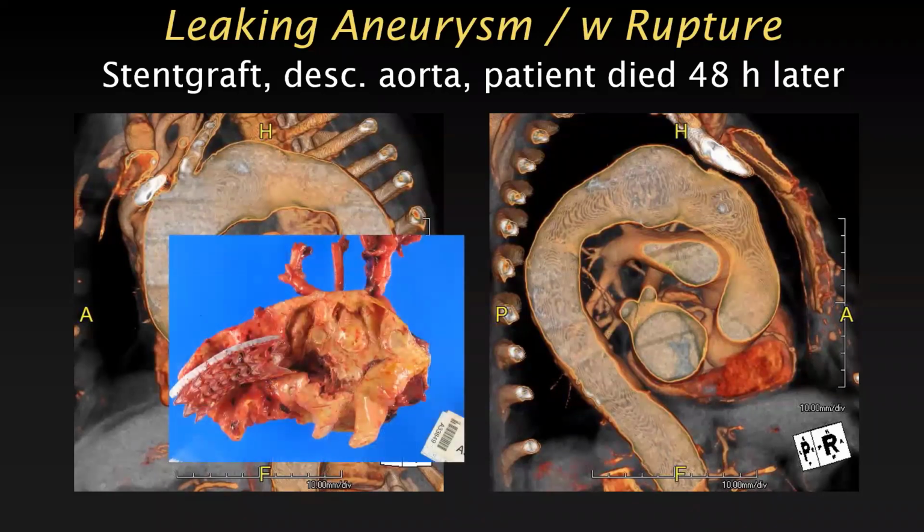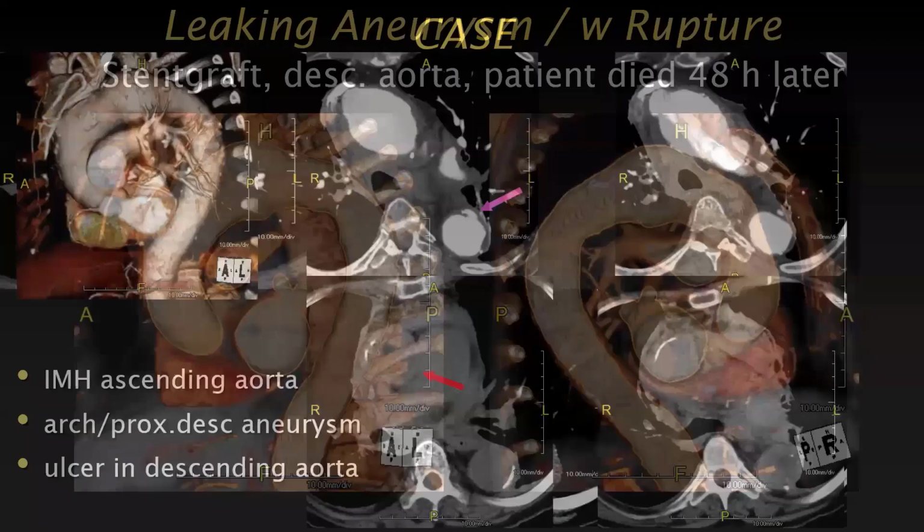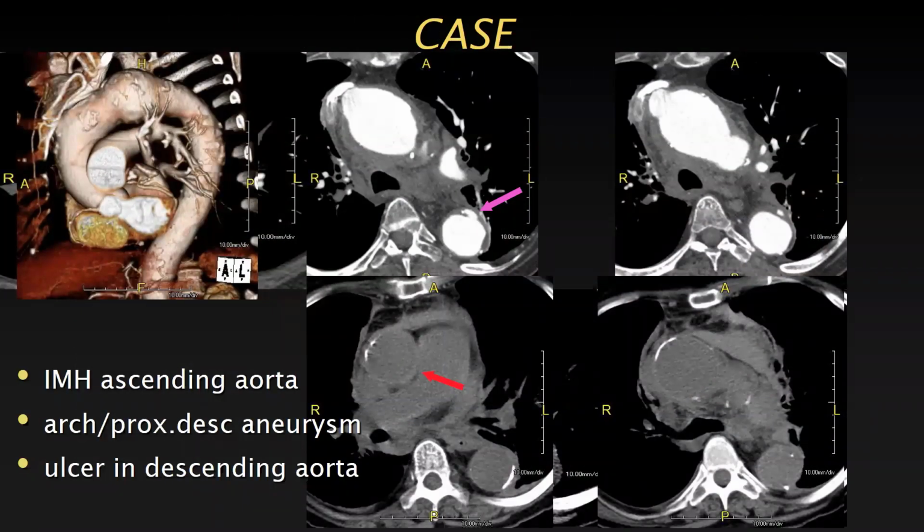You can see, so I thought that the best explanation for the patient's symptoms is a rupturing atherosclerotic aneurysm, because most of the hematoma surrounds the arch, and usually the hematoma is closest to where it comes from. Whereas the intramural hematoma in the ascending aorta is something you would expect with any lesion that affects the integrity of the aorta.